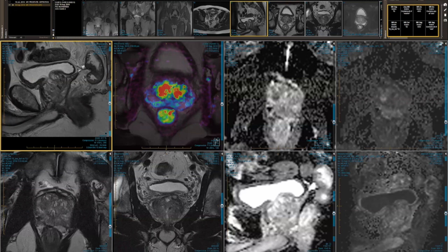Okay, Richard, case 2, please. So the one we've just seen, case 1, that's the easy one. I wish they were all as easy as that, but they're not.